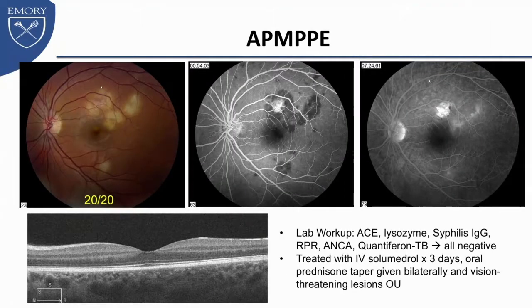In her left eye, she had these lesions overlying her fovea. You can actually see this small lesion just superior to the fovea. She was 20/20, but has these lesions encroaching on her fovea. So we were certainly concerned about this disease process. She had hypofluorescence early with late hyperfluorescence, which was diffuse and subtle over these lesions in the superior temporal quadrant.